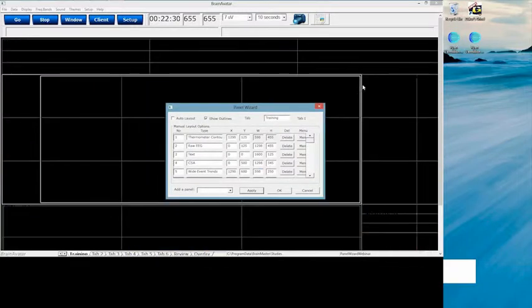This right here shows every panel itself in a design so that it's easy to use. By doing this, I am able to click in these different boxes for each panel, and I'm able to move and design the screen to fit my needs without having to know exactly what the locations are. Now, I personally use the locations to make finer adjustments, but I'll use it for the most part in this design and this nature.